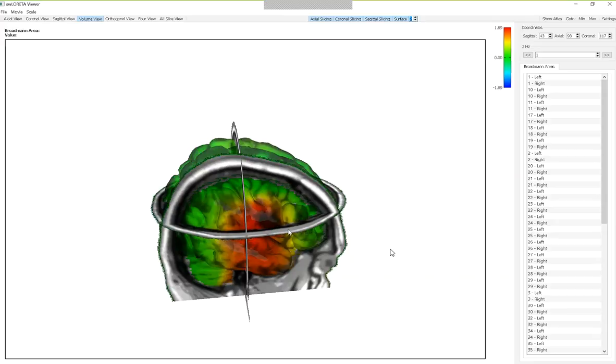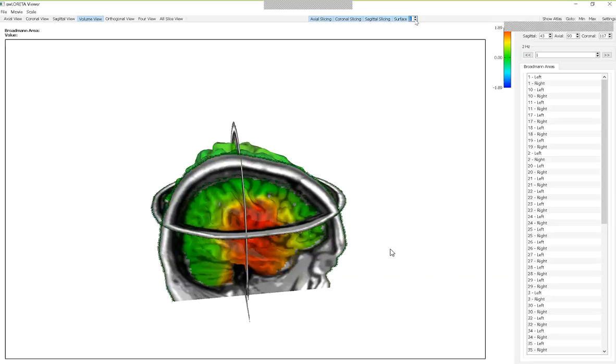There's the upper surface of the cortex. The previous view was the lower surface of the neocortex. So now you can navigate that way in 10 steps, in fact. There's the depth. Again, you can see the yellow around the corner, and then around the sources.